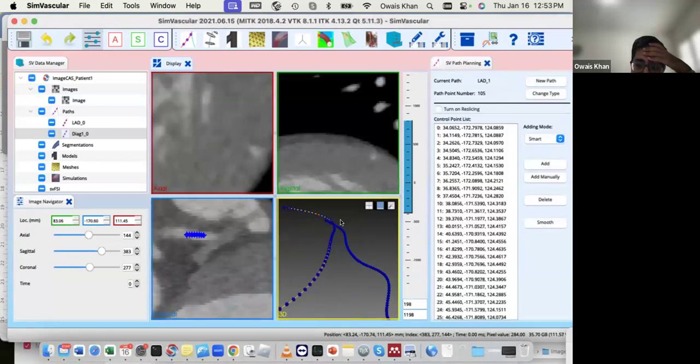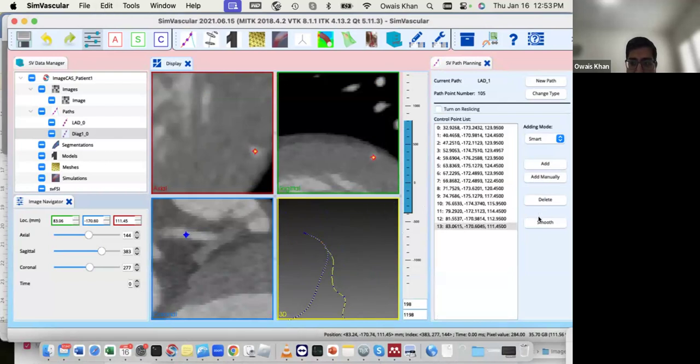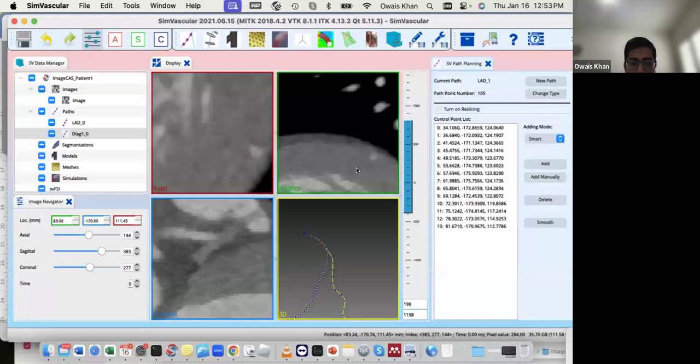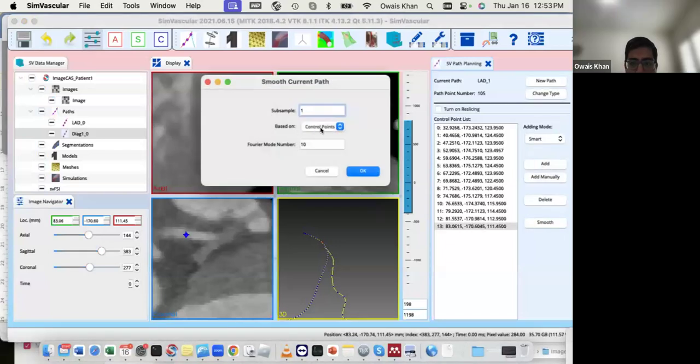And so it shows me lots of points. I think these are too many in my opinion. Shorter is better. Usually, half points gives you more points on the best segment. Oh no, that's not good. So maybe just clear the subsample.